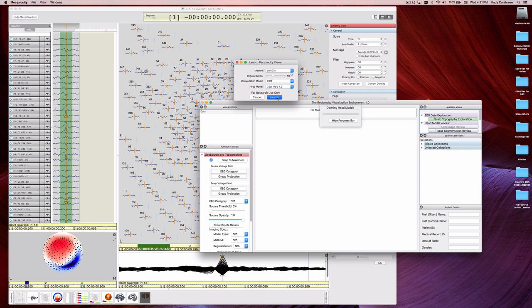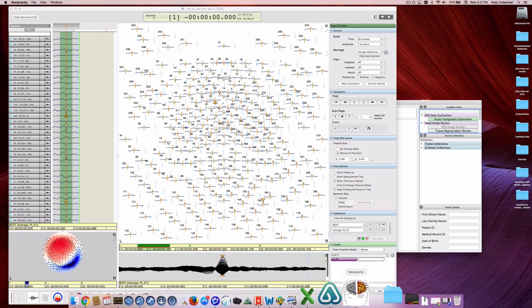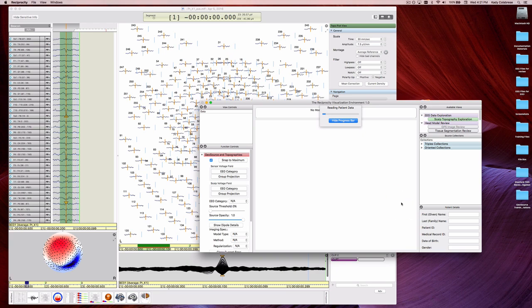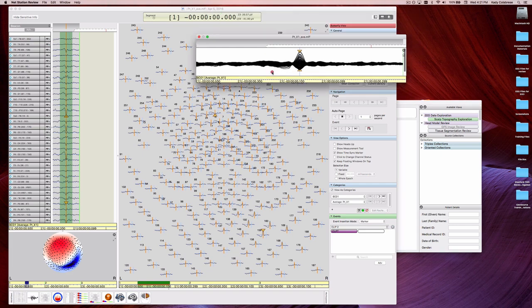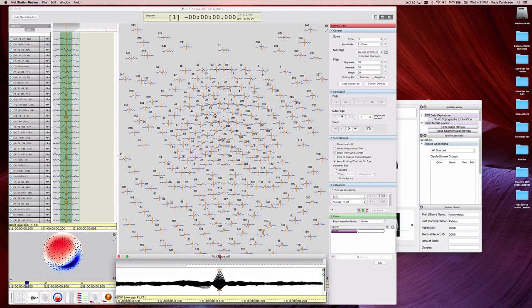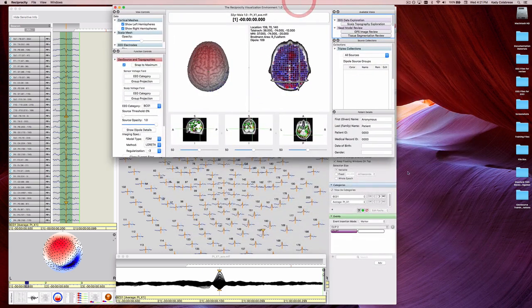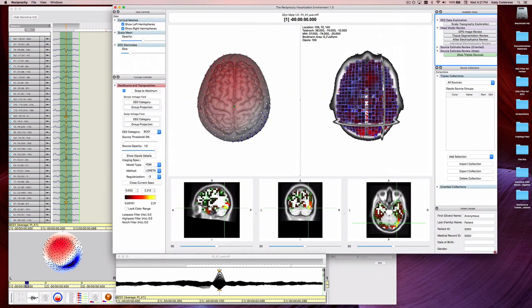The Reciprocity Visualization Environment, or RVE, will load in a separate window. You can see the icon for the RVE down in the dock. Once it is loaded, you can organize your screen to better fit all of your windows. We do not recommend updating your workspace once you have the RVE open. NetStation will then try to launch RVE every time you access the workspace, which will not allow you time to provide user input before it launches.